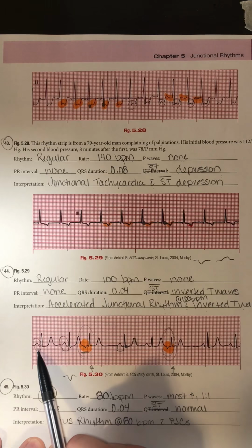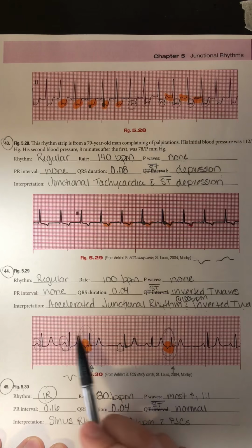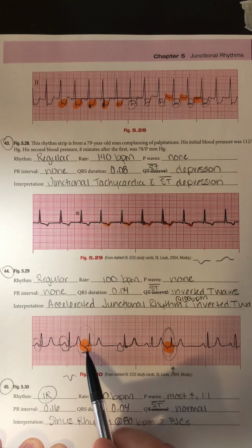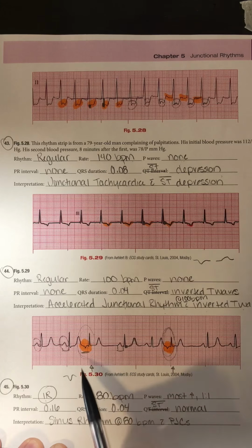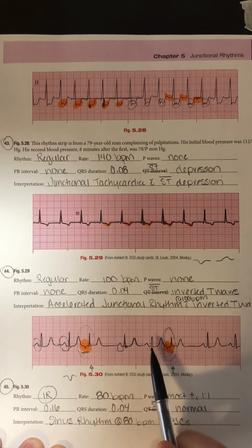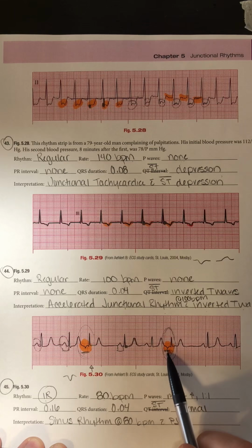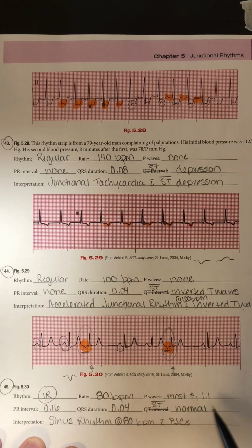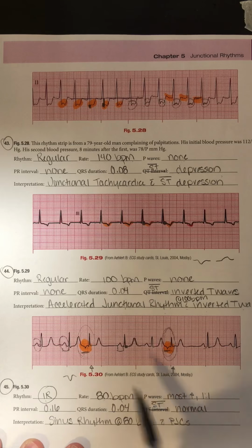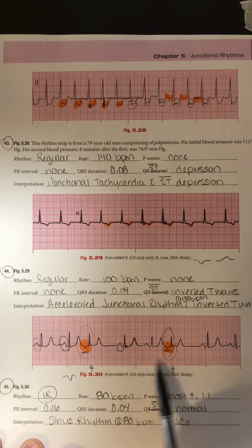So I have a P wave here that's normal, upright, P wave here, normal, upright, and then here, this beat that seems to come early, I have that inverted P wave that dips below the isoelectric line. So that's why I highlighted that one. Then I have a little space. I have a P wave that's normal and upright, and then an early complex again where it has that inverted P wave right here that's been highlighted, and then normal, normal. So I just put most. There is a P wave for every QRS complex. Most are upright, most are normal, but these premature beats have that inverted P wave, making me believe that those are junctional, premature junctional beats.